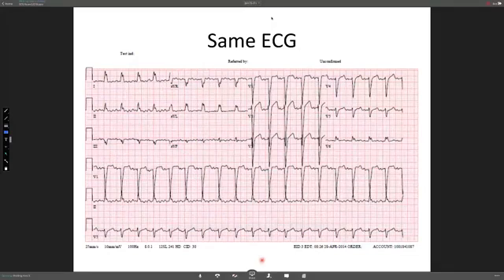So can you speculate what the artifact is coming from based on this? Can we tell whether this is coming from an electrical source nearby or body tremors or anything, or is that hard based on this EKG? Based on the EKG, it's hard, but knowing the patient I think it's likely to be electrical interference, but I honestly don't know. But it's clear that when you look at the chest leads, it's sinus rhythm.